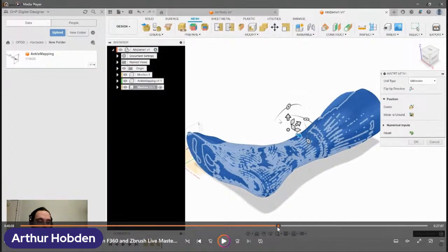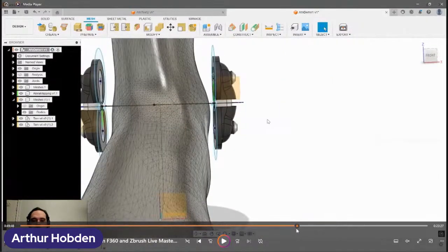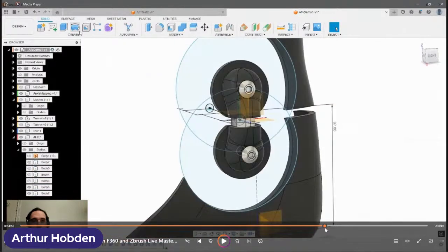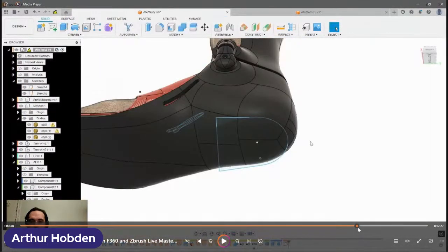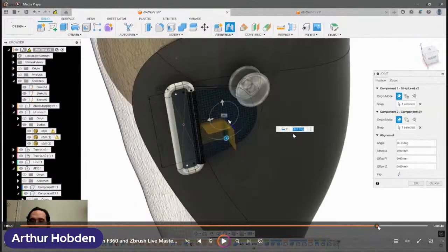From there, we were able to bring in different templates and different consumable files and map them very quickly to that scan that we prepared. And with a few simple clicks, those quad meshes can turn into working surfaces with high accuracy, good organic geometry, and just a matter of taking the time and adding the features you need between each of these features that you brought in.